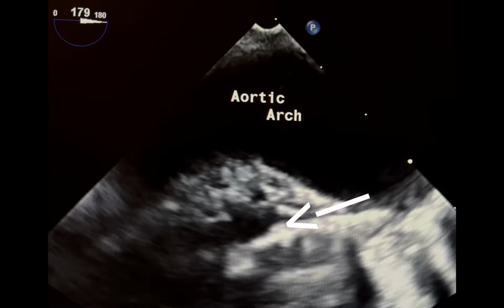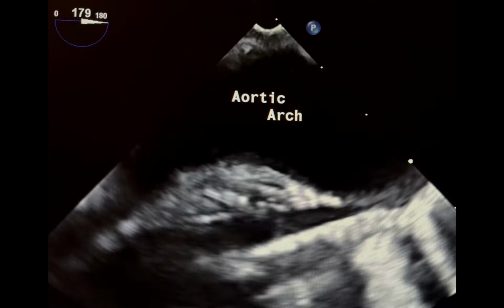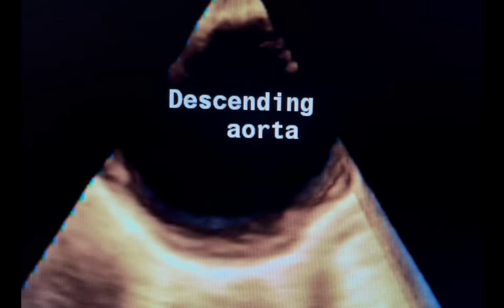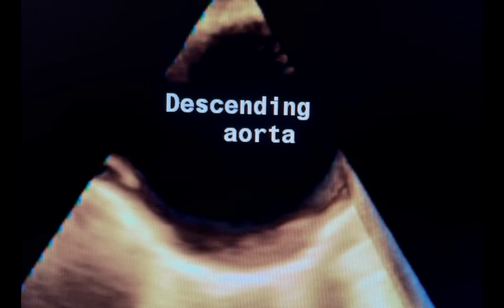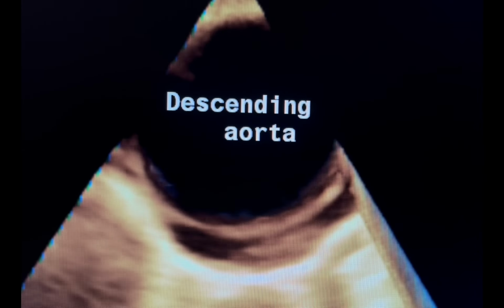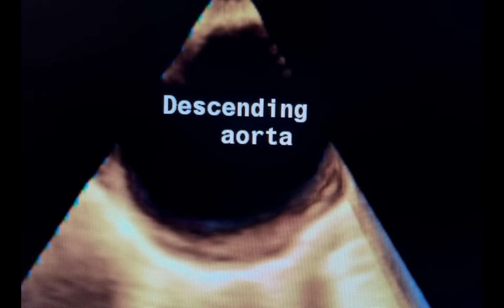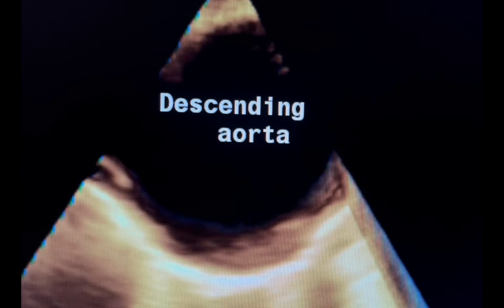The pleura lies adjacent to both the aortic arch and descending aorta, particularly on the left side. On CT or MRI, fluid or air in the pleural space, such as in hemothorax or pneumothorax, may be observed tracking near the descending aorta, but it typically doesn't surround the entire aortic structure.